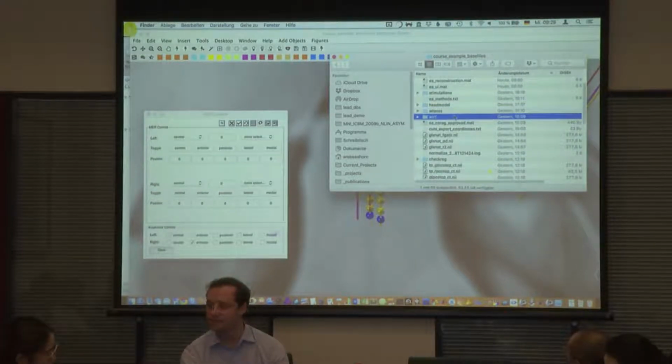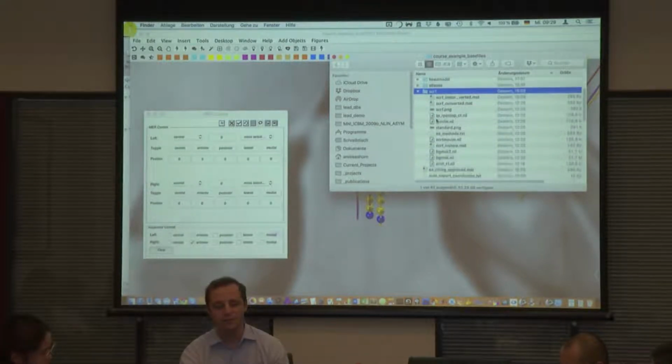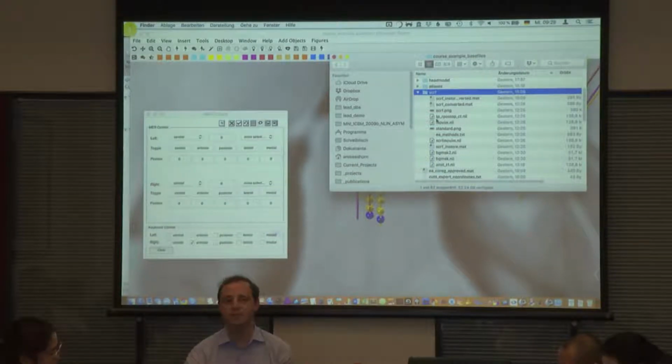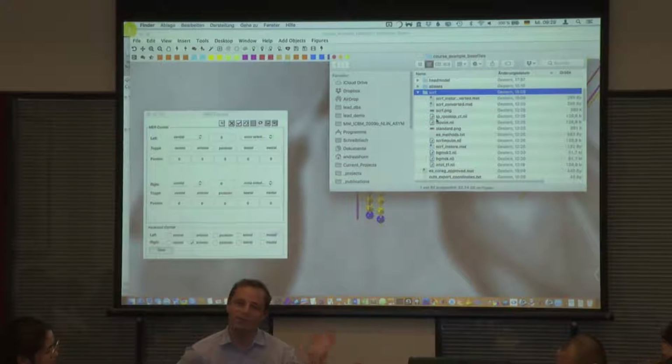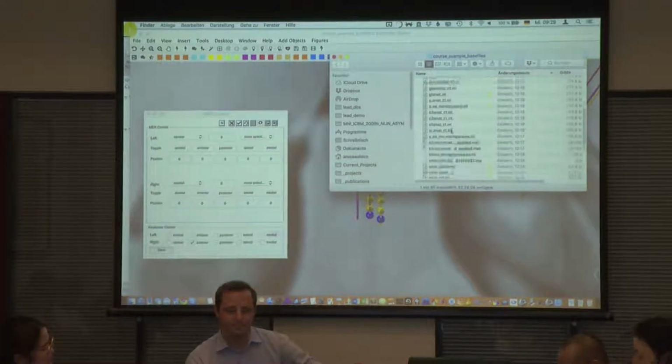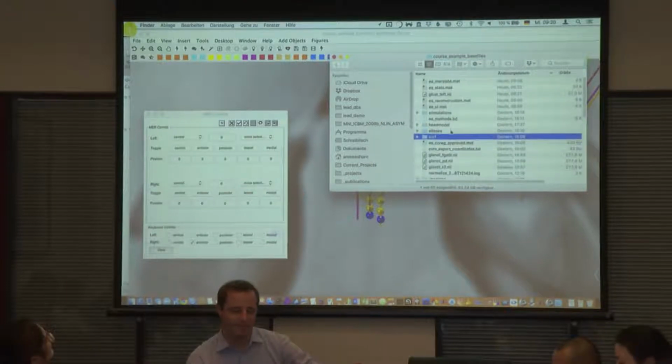One more thing that Friederike told me to show you is this folder. It's called the SCRF, which stands for subcortical refine, and that is basically where the brain shift correction is stored. So if you ever have problems with brain shift or want to rerun it, then you can just delete this folder and rerun it. That's helpful to know, because if the normalization was wrong and then brain shift ran wrong, you just want to rerun everything with brain shift correction, and that's everything stored in this SCRF folder. Yeah, so that's fine.